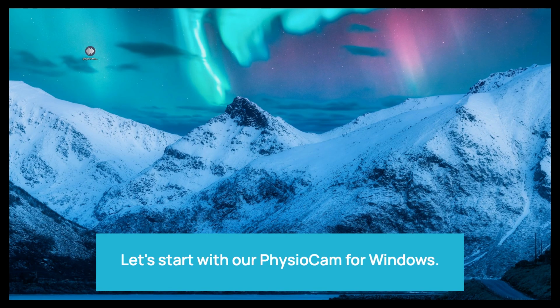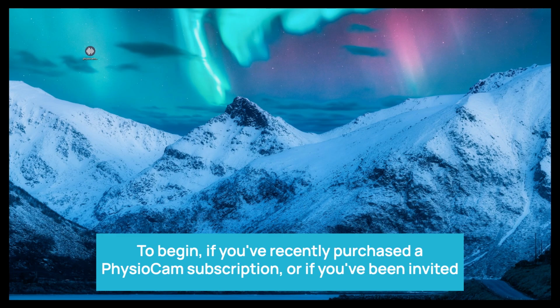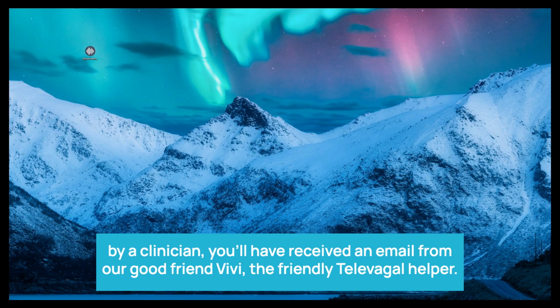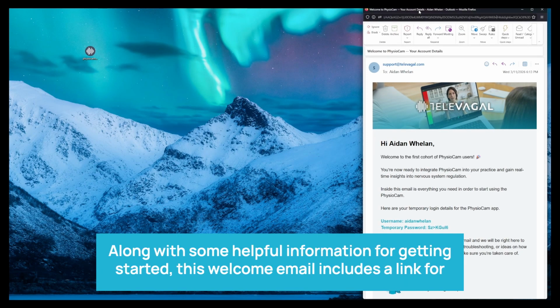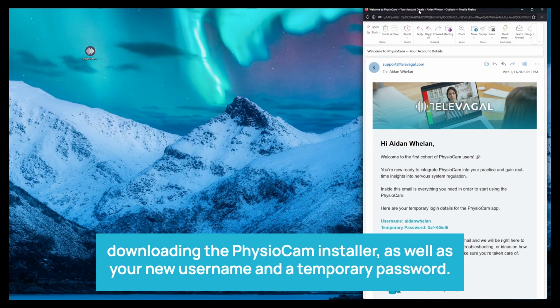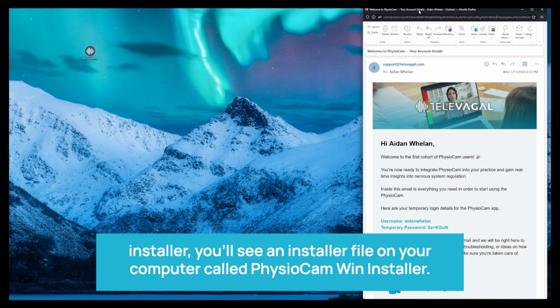Let's start with our PhysioCam for Windows. To begin, if you've recently purchased a PhysioCam subscription, or if you've been invited by a clinician, you'll have received an email from our good friend Vivi, the friendly Televagal helper. Along with some helpful information for getting started, this welcome email includes a link for downloading the PhysioCam installer, as well as your new username and a temporary password.